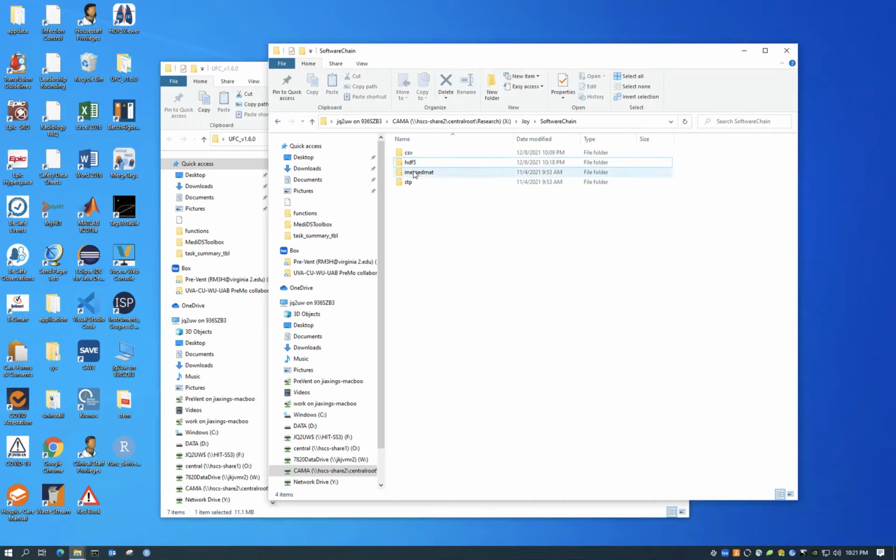And then after you get the multiple HDF5 files, results files from those batch algorithm processor, you will have to merge them into one result file per one patient or per one study subject. With that result, you can then choose whether or not you want to convert it to a CSV file or a table format file. Okay, so let me show you how the UFC works first.